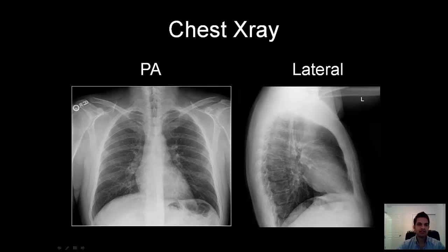Hi, I'm Raj Gupta. I'm going to take you through how to interpret a normal chest X-ray and the search pattern I use to help me not miss any findings. It takes a lot of experience to actually put together the pathology and be able to detect it, but you need to start with a nice search pattern that you use every time so that you don't miss anything.